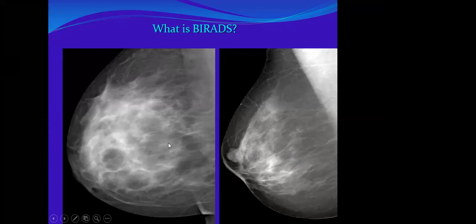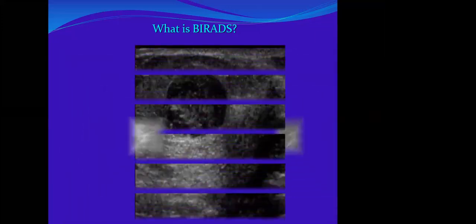If you did not see the previous, if you have seen it only here, how will you describe this? I will describe it as a mass. Excellent. A mass. Which mass? How do you describe the mass? It is partially obscured. Excellent. It's a partially obscured mass.